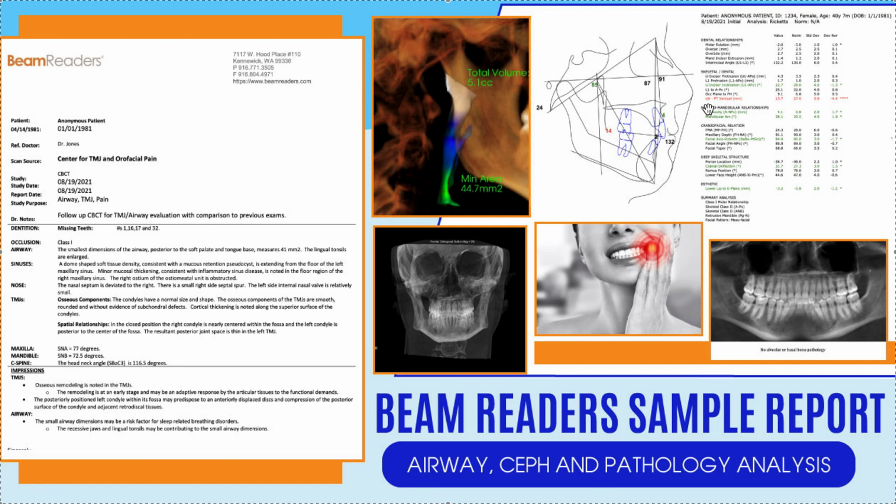So let us know. So we won't go over what the Ceph report says, although the patient is very low angle clearly, which you can see, upright incisors, but pretty unremarkable Ceph report. What else? Lower lip to E-plane, yeah, definitely behind. Okay, anyways, let's talk about the report.